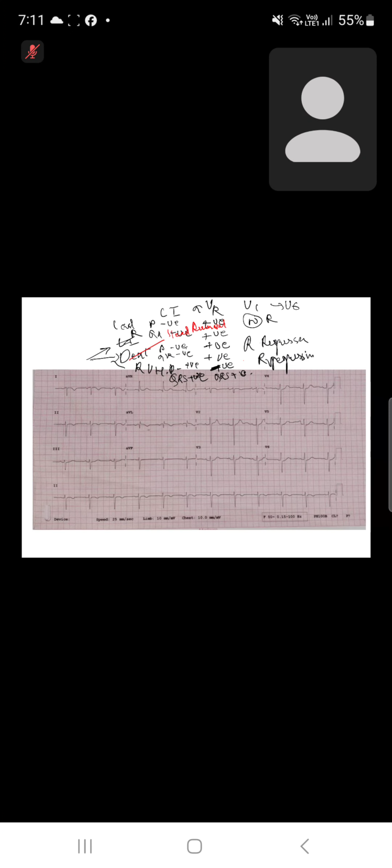Two things I just wanted to mention. See, suppose in the lead reversal you imagine you corrected it here and put those leads in the places they should be. What is the diagnostic possibility in this electrocardiogram?